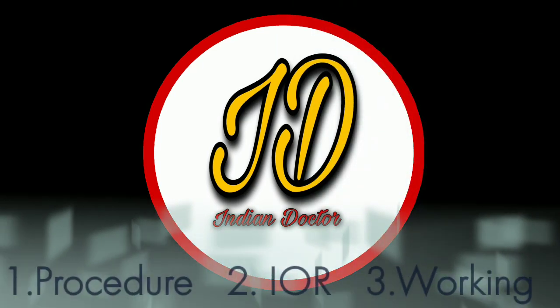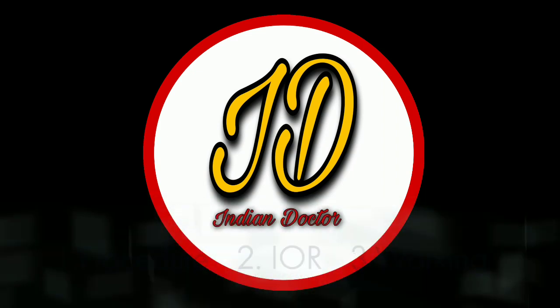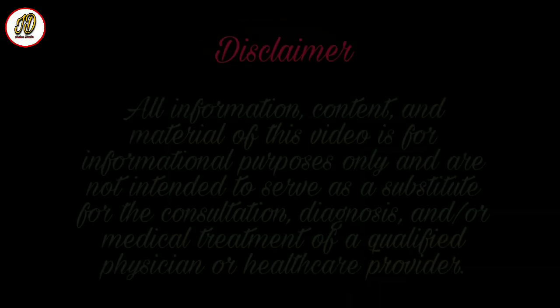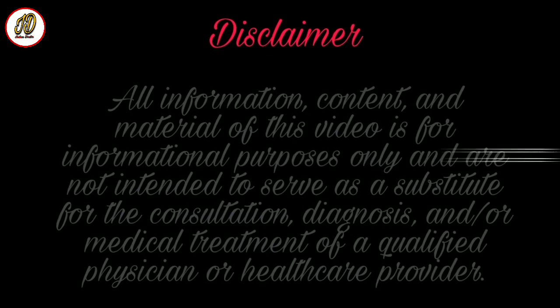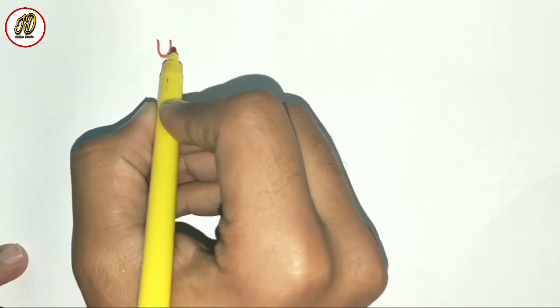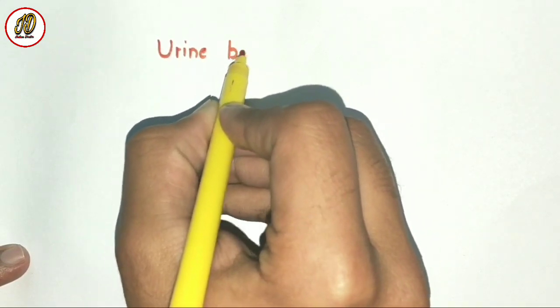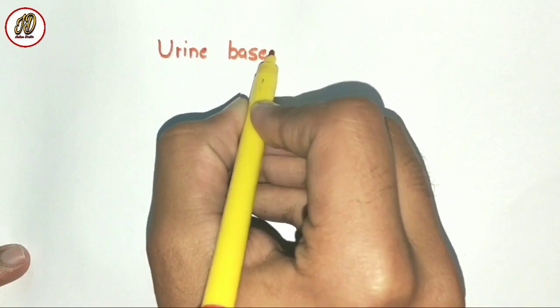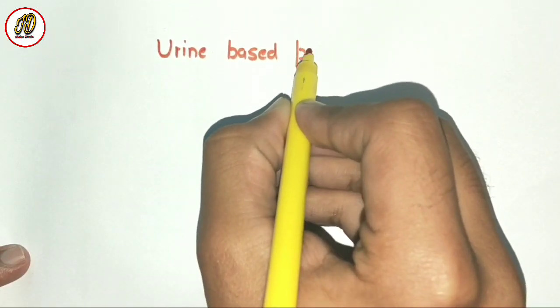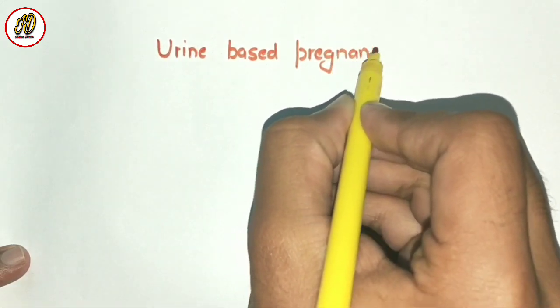In this video we are going to cover the procedure, interpretation of the result, and how the pregnancy test kit works. Let's begin. Urine-based pregnancy test.